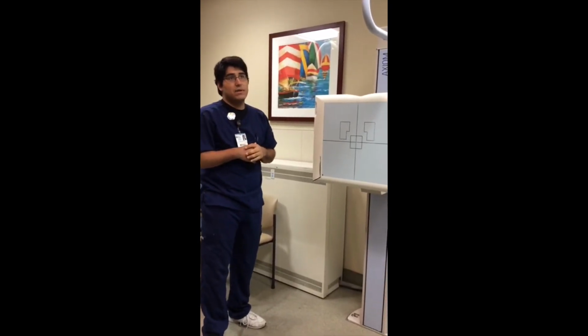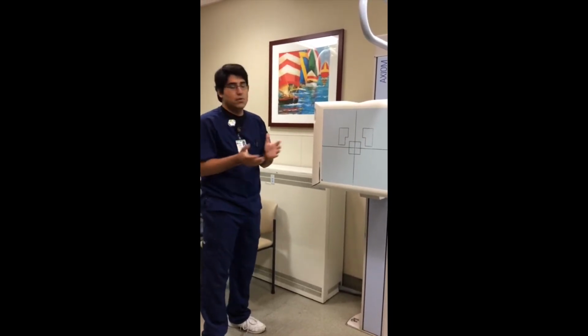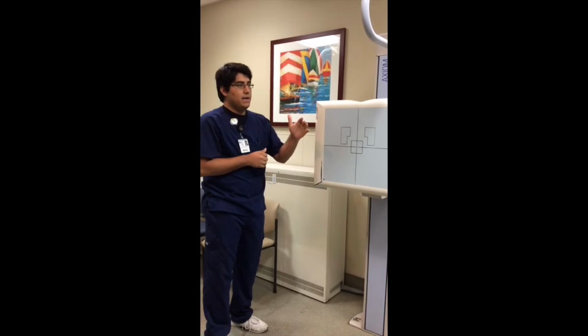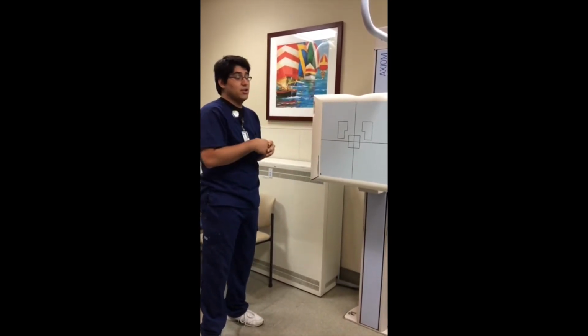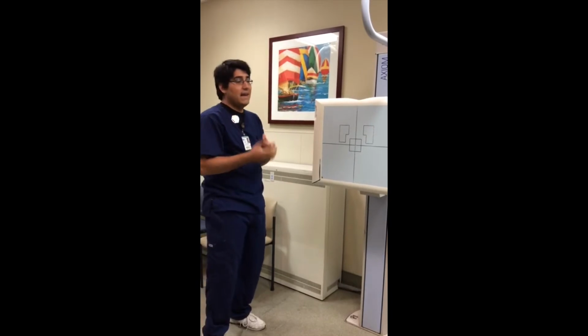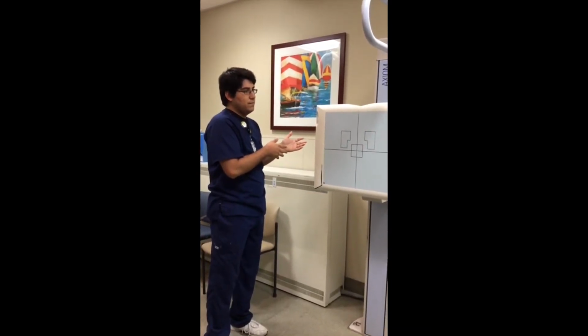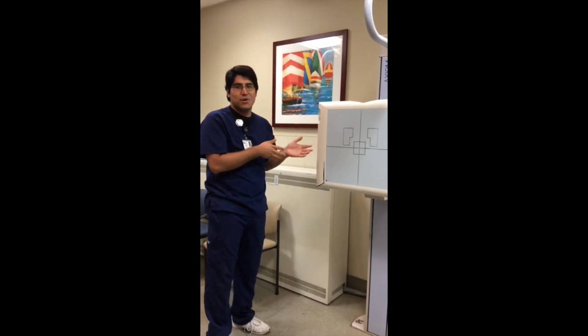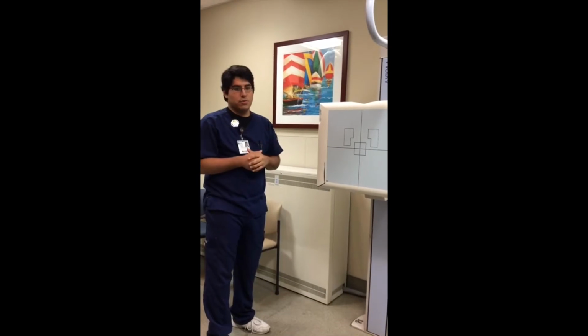So basically what they had before is that there was an extra step. You would do the exposure, then there was a photo timer behind this that would pick up the x-rays, turn it into light, and then that light would turn it into, I want to say, an electrical current, which would then tell the machine to shut off the exposure.